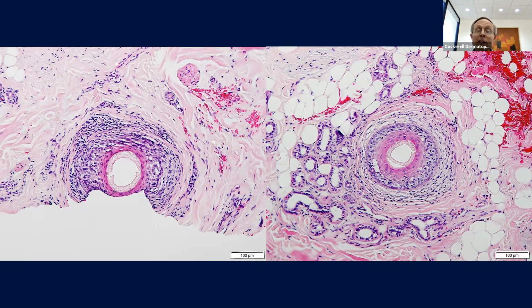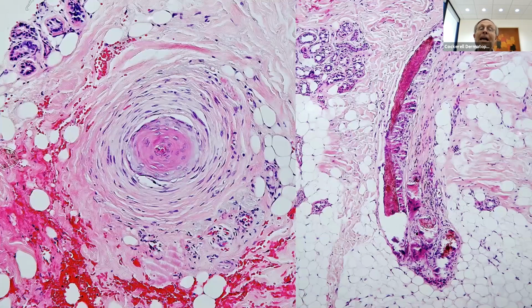And then my belief is that CCCA and LPP are the same disease. So really, you can narrow it down to 1 if you believe that, because my thinking is that it's probably a variant of lichen planopilaris that's induced by pomades in patients that have a genetic propensity to get alopecia, which are usually African-American patients, as we all know. So to me, that's just traumatically induced LPP from putting a lot of stuff on your scalp for many years. If you think of it that way, then there's only 1 diagnosis. So whenever you get this kind of change around follicles, especially near the infundibulum and isthmus of the follicle, it's LPP, period, the end, over, finito.